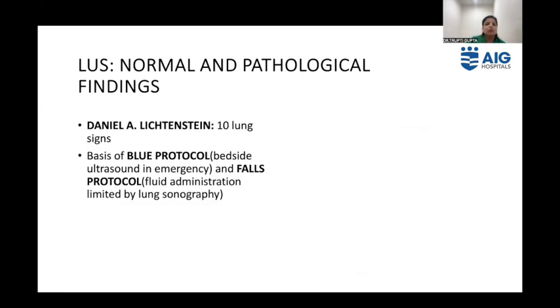So, coming to normal and pathological findings in lung ultrasound, Daniel A. Lichtenstein has described 10 lung signs, which are the basis for the BLUE protocol and FALLS protocol. So, we'll be describing each lung sign in detail now.